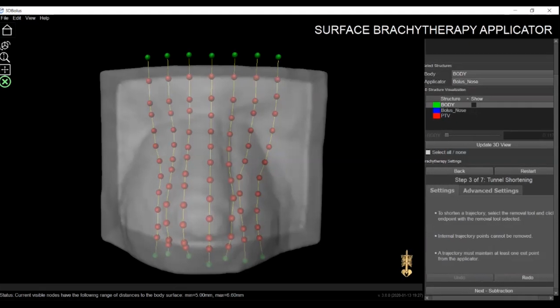And if you go back, you will be losing only the current progress in the current step. Also, you can restart the whole workflow with one button and go all the way to step one. We think this is highly beneficial for users, to be able to go through steps and go back if they used some feature in a way they wanted to use differently.